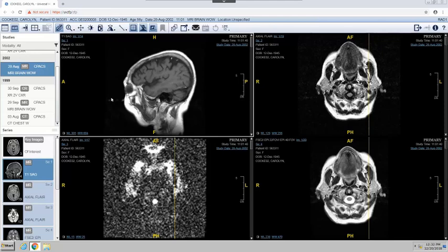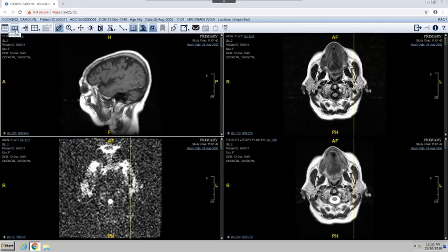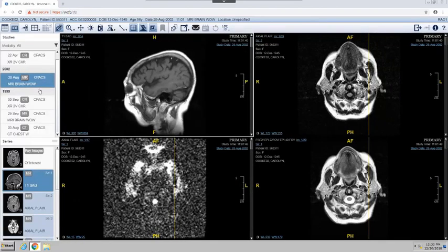The navigator contains all studies available for a patient in chronological order. By default, the navigator displays automatically when a study is opened in the viewer. To open and close the navigator manually, select the navigator toolbar icon. You can configure the navigator so as to not display automatically when opening a study. Contact your GE service representative for details.